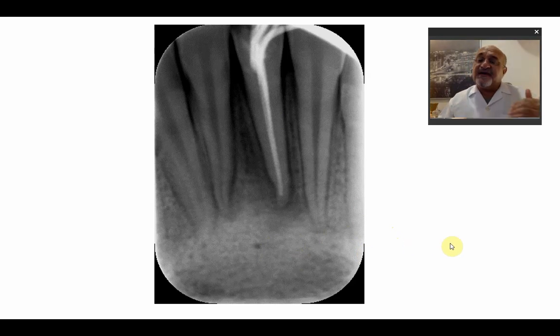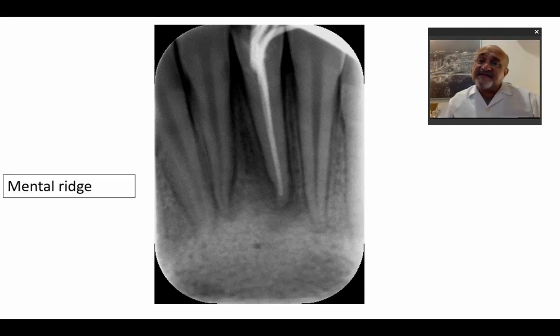So if you see a radiolucency, it is almost in the midline. I can't say it is in the exact midline. It is located on the lingual surface of the mandible. The size differs. It is a radiolucency that ranges from a small pit to a foramen, and this is surrounded by the genial tubercles, which I will show you in the other slide.